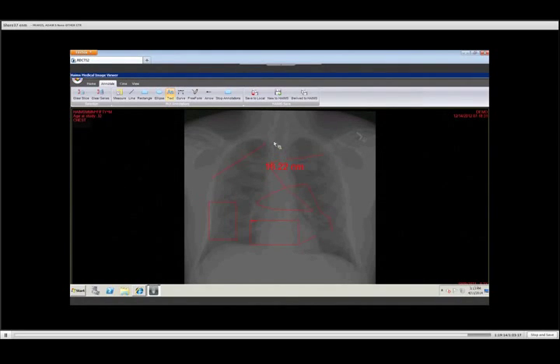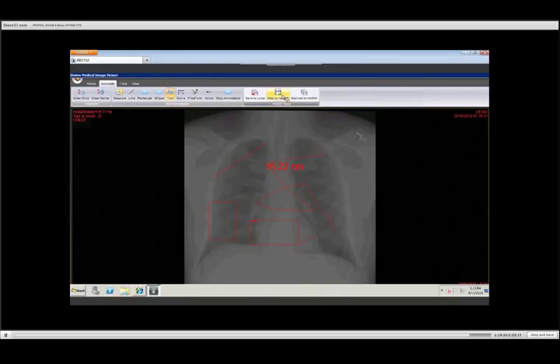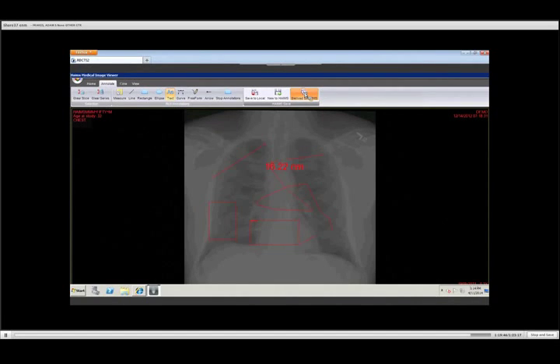From here, you have the ability to save this image to your local drive. I could simply click on Save to Local, and it would save what I'm looking at with all of my annotations on it. I could simply click New to HAIMS. That would import this picture with all of my annotations on it into the HAIMS application as a brand new JPEG picture. Or I could amend it or derive to HAIMS, whereas I just click on the action button.